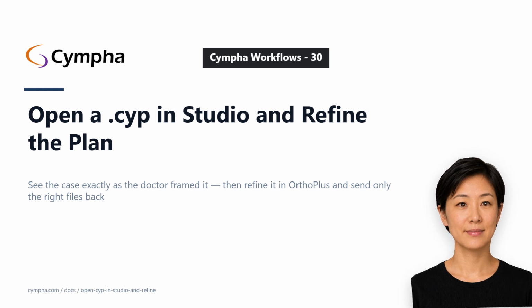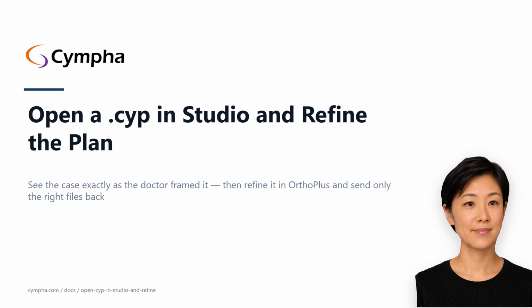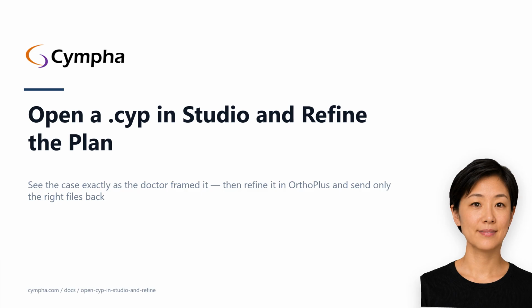Welcome to GuideMia. Today we're going to talk about opening a Cases Studio project file, the .cyp, and refining the plan. This one is for designers who've just picked up an assignment and want to see the case in the same scene the doctor was looking at, same camera angle, same measurements, same photo gallery, before touching anything.